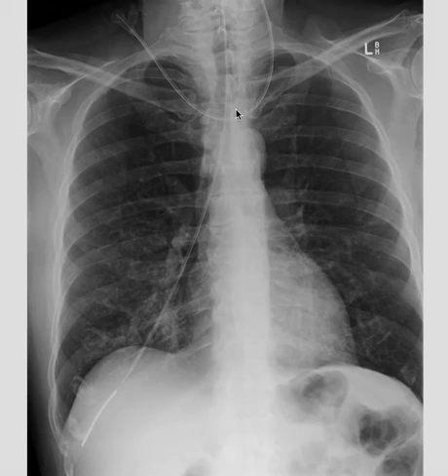So this nasogastric tube would obviously have to be taken out, but the X-ray really demonstrates the importance of imaging once the nasogastric tube has been inserted in order to check for its correct positioning before it can be used.